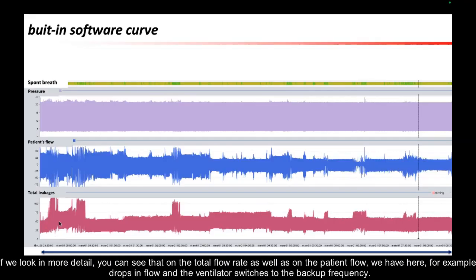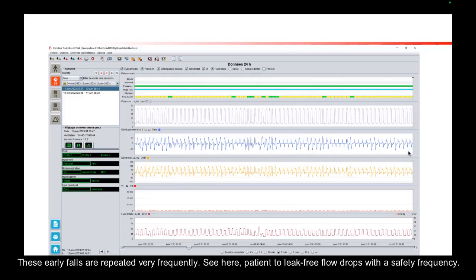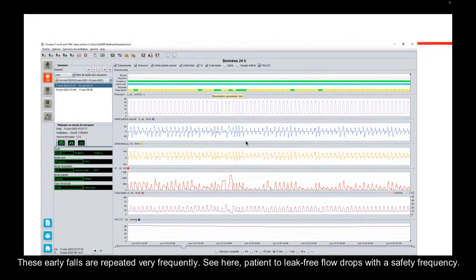If we look in more detail, you can see that on the total flow rate as well as on the patient flow, we have here, for example, drops in flow, and the ventilator switches to the backup frequency. These drops are repeated very frequently. See here, patient flow, leak-free, drops with a safety frequency.